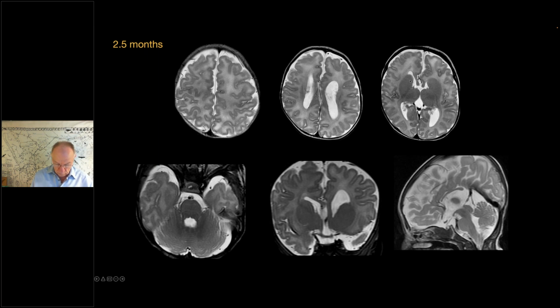The basal ganglia are thickened, dysmorphic. You can see that the right and left basal ganglia have different morphology, better appreciated also on the coronal images. The basal ganglia are not symmetrical in morphology. The frontal horns are also dysplastic. No abnormalities in the posterior fossa. The corpus callosum is also slightly hypogenetic. It is slightly foreshortened but almost complete.